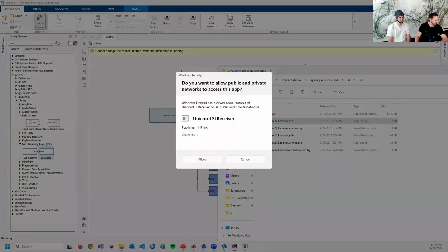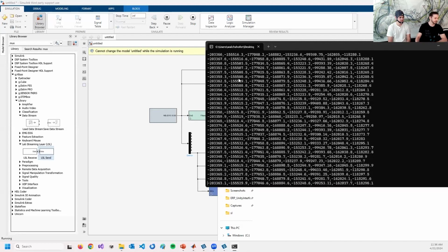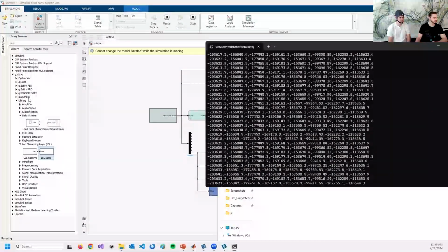So this one is just looking for data streams. And if I find a data stream, I print it to the console, but you could create a nice looking GUI with some scopes or whatever you want. I can already see the stream name that I named before, the raw data stream, and can receive data from 8 channels that I'm sending from Simulink to my own application.